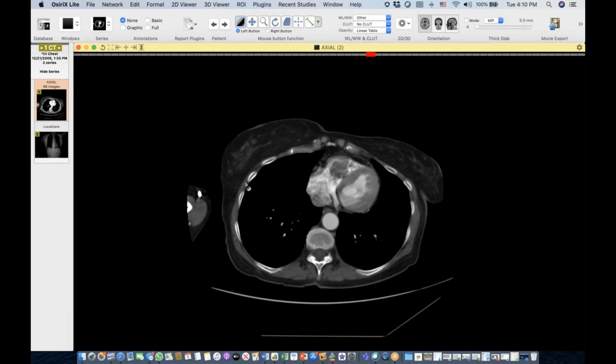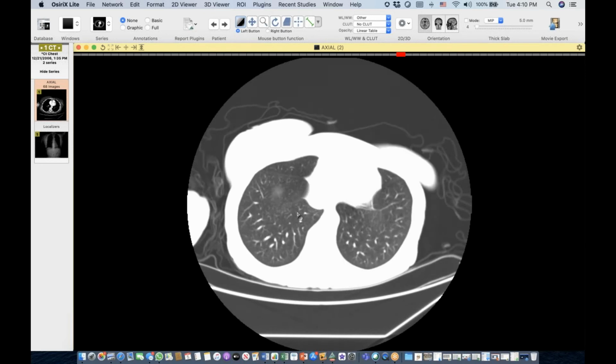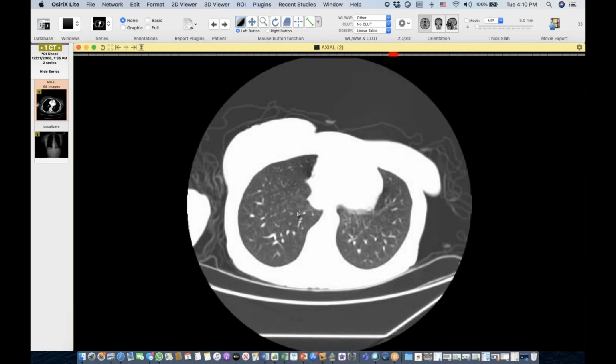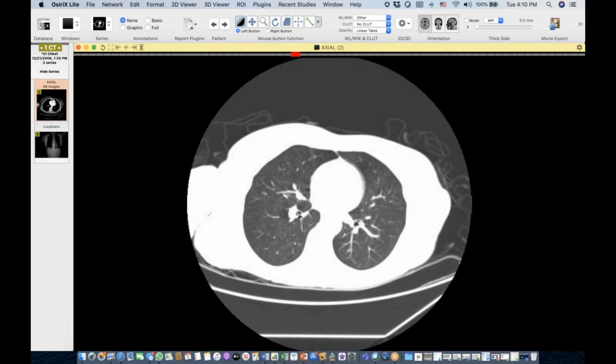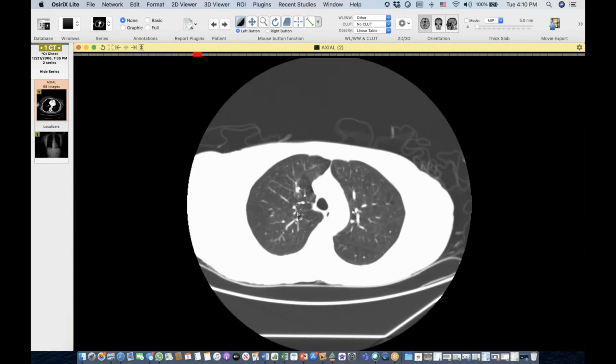All right. So again, this was just a quick show and tell. I don't even remember if there were lung mets. Let's just take a quick look. I don't think there were. Nothing is really jumping out at me here.